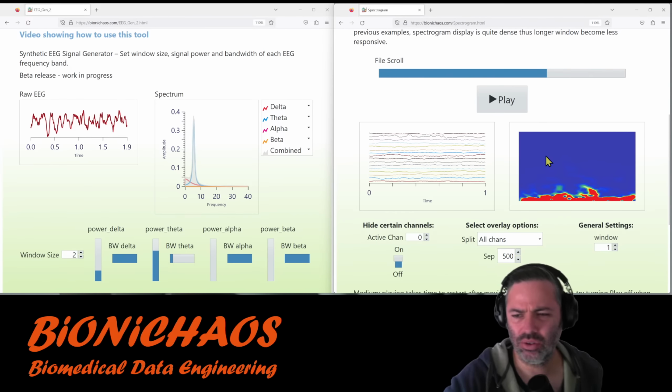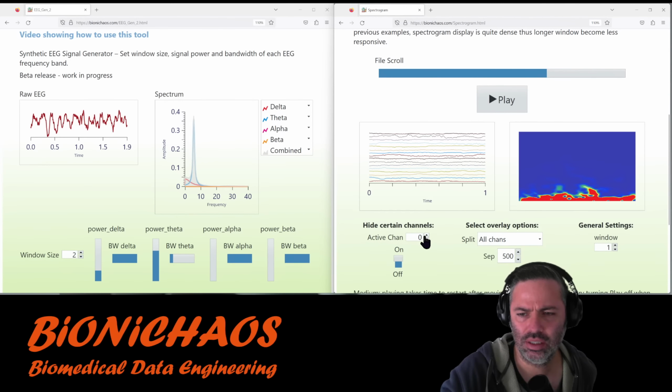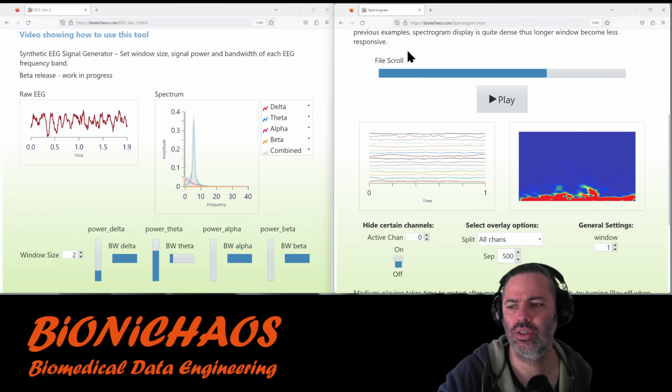There is an automated signal selection. In this case, it's automatically selecting a signal, and the algorithm is simply taking the largest amplitude.